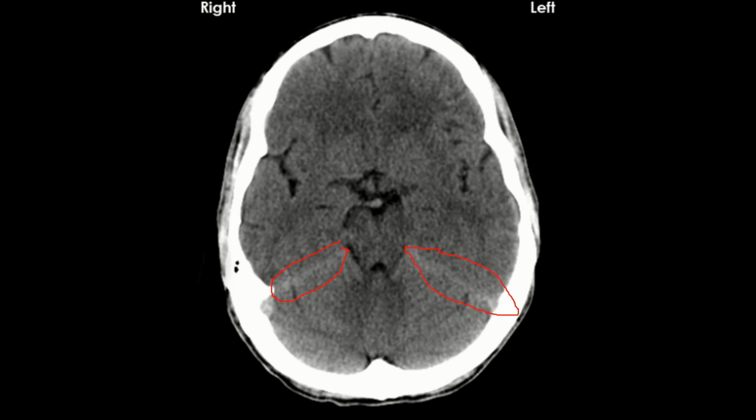So it's like a sheet all over the cerebellum, but it's thickened at these portions, and so you can see it better. It's all over the cerebellum, but being thin, it's not evident. This is important from a pathological point of view, because subdural or subarachnoid hemorrhages can track along the tentorium cerebelli, in which case they would appear more white.